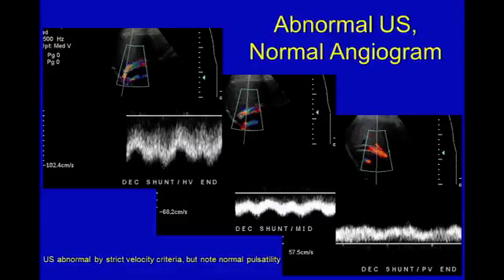So what I'll remind you to do is to also look for this pulsatility, and remember that if you have a nice big stent, the velocity to get a certain volume of blood flow through that will be lower than if your stent is a little bit smaller. So take everything with a little bit of a grain of salt, and unless you have elevated velocities that are focal, or unless you have low velocities with flattened waveforms, be a little cautious with just using the numbers.